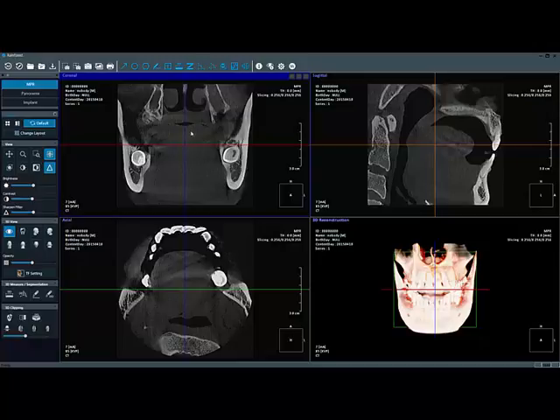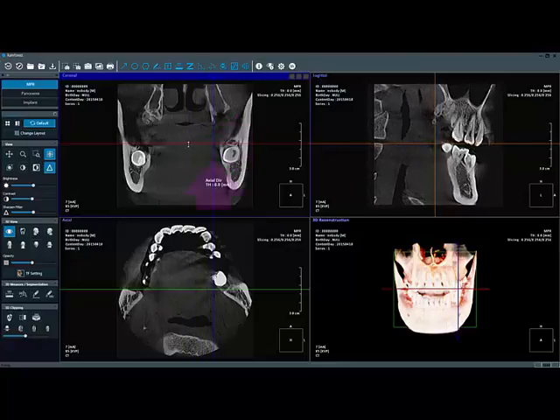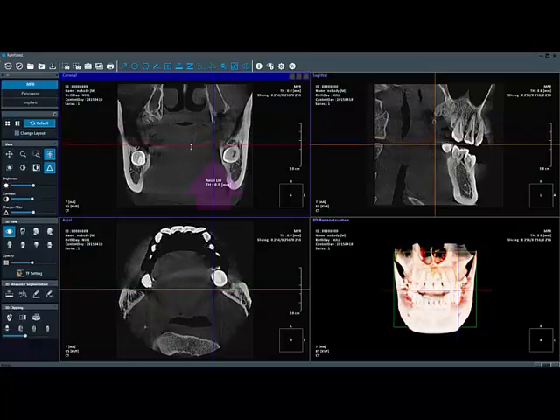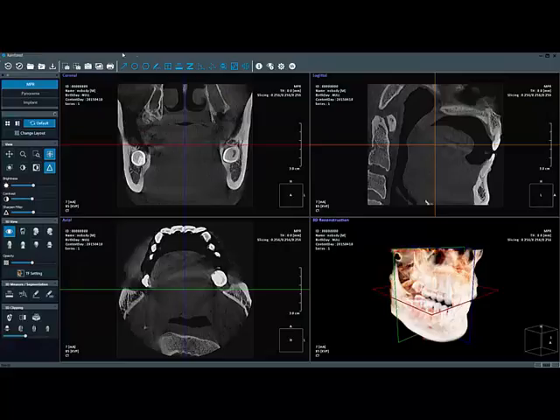Axis shows the location of each window, so if you move any of the axes, the other axes will move along with it. And if you place your mouse away from the intersection, you will be able to rotate the axis. We have a main toolbar located on the top region, and a view control located in the left region. The view control allows you to manipulate or have control over the patient's images with each view tab.